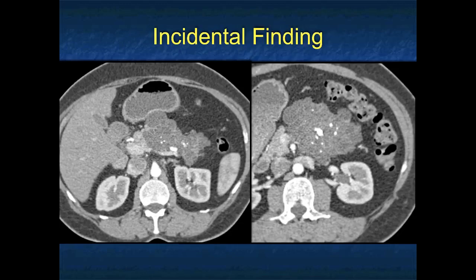What about this case? Pancreatic mass, cystic, body and tail of pancreas, punctate calcifications. Cystic lesion, punctate calcifications, I always think about serous cystadenoma. Yes, with location, I could think about a mucinous cystic neoplasm or MCN. It's not going to be a lymphoepithelial cyst. It's not going to be a cystic neuroendocrine tumor.